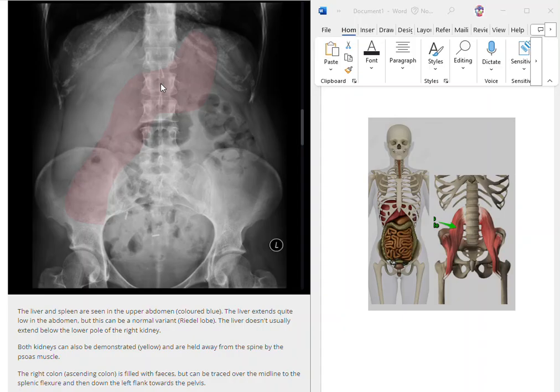We got to get used to navigating the map by knowing where the different organs and structures of those organs lie in the body. All right. So ascending colon on the right side starts low and works its way high up to where the transverse colon would be. Then crossing over the spine, transverse colon, what's going to happen here is a flexure that we can see very clearly on this side.